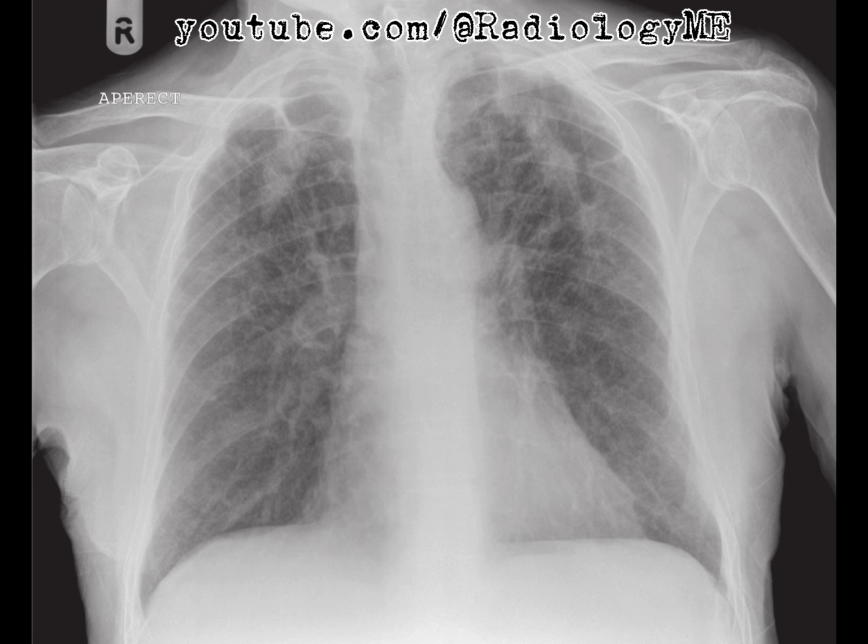All right, so if this patient has a history of occupational dust exposure, perhaps they were a miner or worked with ceramics, we need to consider silicosis or coal workers' pneumoconiosis. Both of these could account for the symmetrical upper zone fibrotic changes we're seeing here. Now, these mass-like lesions we're looking at could represent progressive massive fibrosis, or PMF, which is a complication of pneumoconiosis. But without any history of dust exposure, we'd need to start thinking about other causes of upper zone fibrosis.